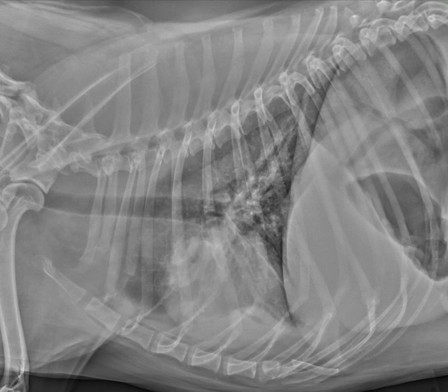Here we have a 12-year-old mixed breed dog who presented for screening thoracic radiographs. Once you've reviewed the radiographs using your systematic approach, then go ahead and watch the video.